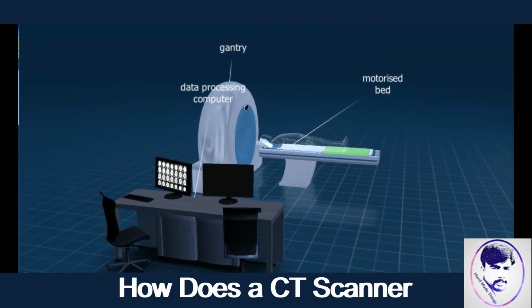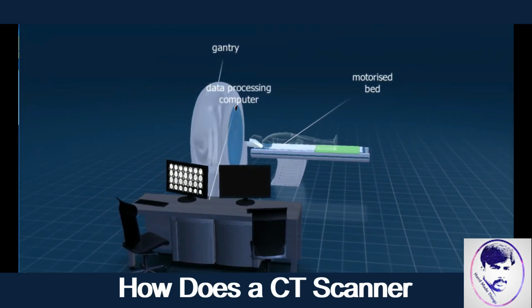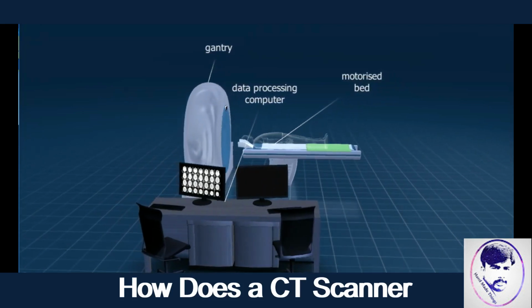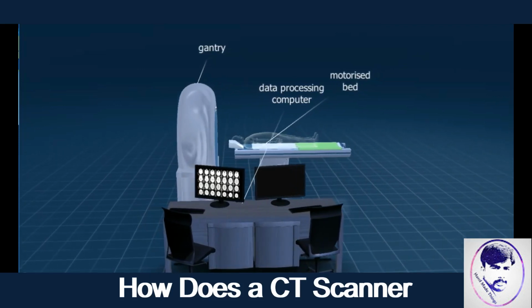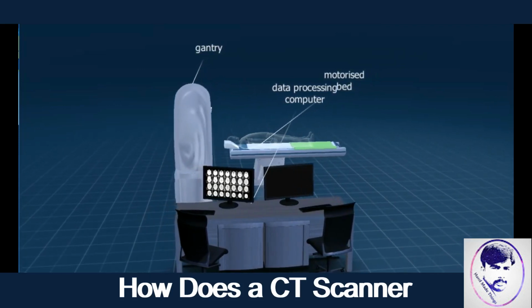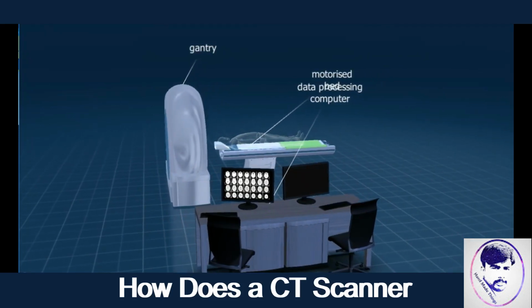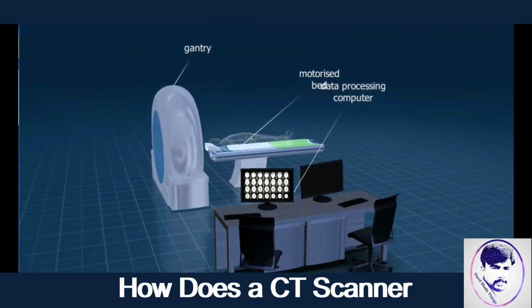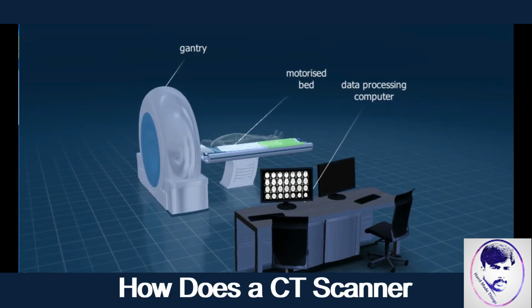However, the diagnosis of numerous injuries and diseases requires sharp images of the tissue layers not visible in a conventional radiographic image. Computed tomography is an improved version of conventional radiography, developed to map these areas. It was developed by scientists Alan M. Cormack and Godfrey N. Hounsfield. This achievement earned them the Nobel Prize in Physiology or Medicine in 1979.